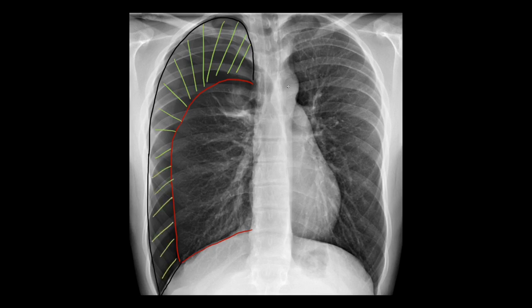Do you see any further signs? Well, the diaphragm is again pushed downwards. It's at exactly the same level as the left hemidiaphragm here. The right heart border you can just about make out over there. And you can see onset of tracheal deviation to the left side. So again, this is a large pneumothorax. I think it's got early signs of tension, and this also needs urgent decompression.